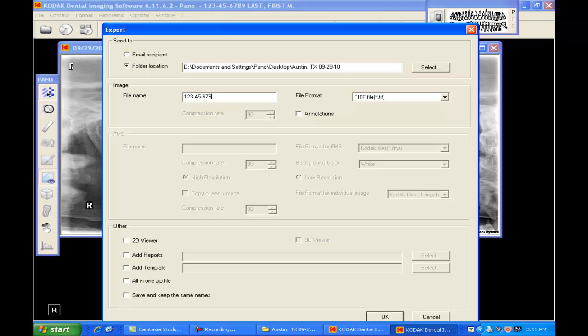It must have the dashes and be done correctly for LHI to accept this. Once you've typed in the social, you will put in a comma and a space. You will now type in their last name, and it must be in all caps, so I recommend that you keep it on cap lock. Do not put a comma here, simply a space.